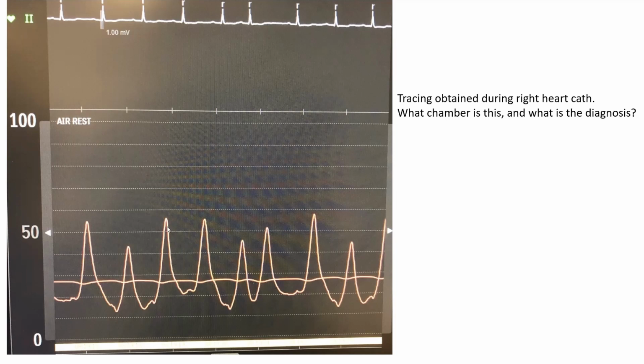When the peak is very narrow and peaky, and sometimes with a slow upslope, sharp downslope, or with equal slopes up and down, this is usually an atrial. In this particular case, a left atrial or wedge pressure. Okay, so using those features, this suggests that what we have here is pulmonary capillary wedge pressure or left atrial pressure. Another thing you can look at is the EKG.